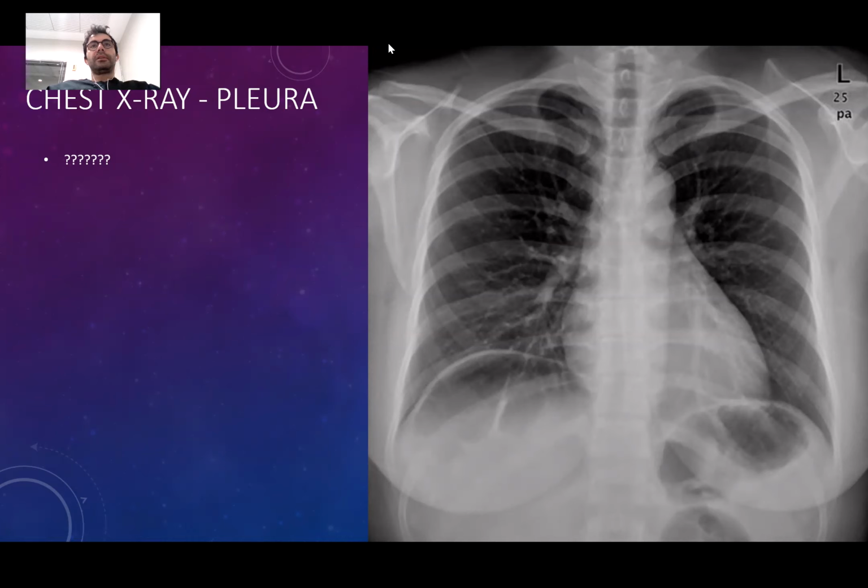That's true. But if you look at it a little bit carefully, doctor, thanks for the diagnosis, by the way, it's actually lined by the colonic lining. So this is actually colon, which has gone up beside the liver, and it is not free air, but loculated air inside the colon. But thanks for the diagnosis. Please do not memorize this case. The air can belong to many other things as well. Okay.